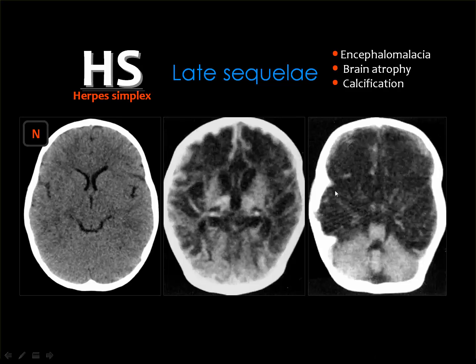And this is frequently seen in the pediatric hospitals, where the patient had herpes encephalitis or any type of encephalitis, and the follow-up will show the end result of this attack of infection: damage of the brain tissue, many areas of liquefaction or encephalomalacia. Sometimes you may get calcification, but you do not see contrast enhancement if you inject the contrast material.